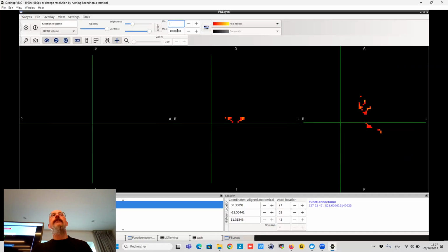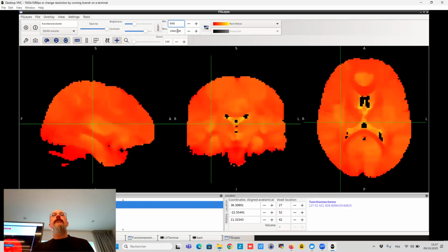Yeah, you can mask it. I'm trying to. Finally, there is not a lot of things to see. It's a strange image because it's a bold image. Normally, you should see the signal higher in the cortex, but in this image, the highest signal is in the white matter, because you projected everything in the white matter based on the priors you entered during the process.